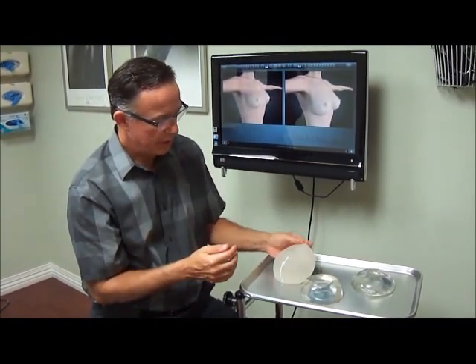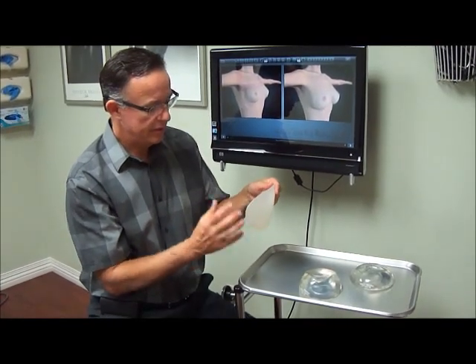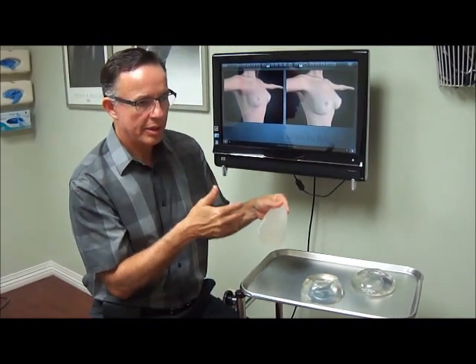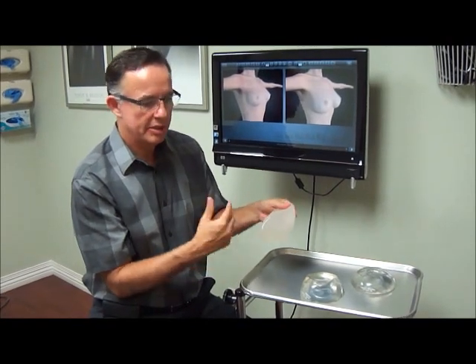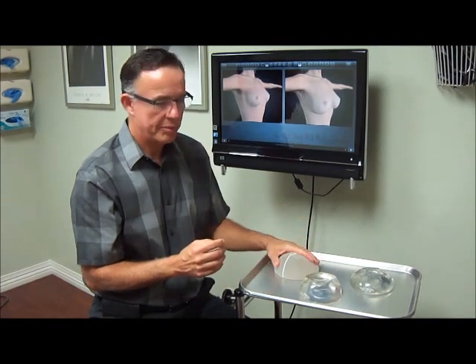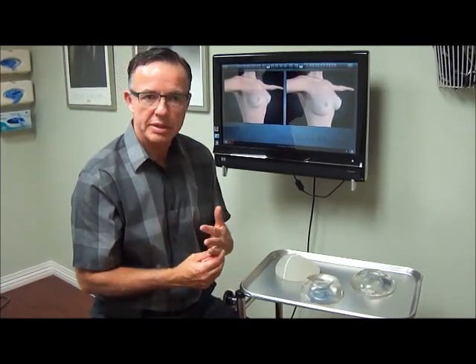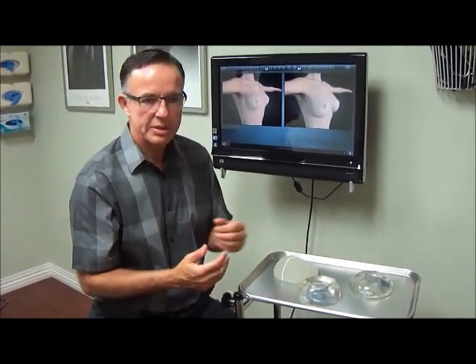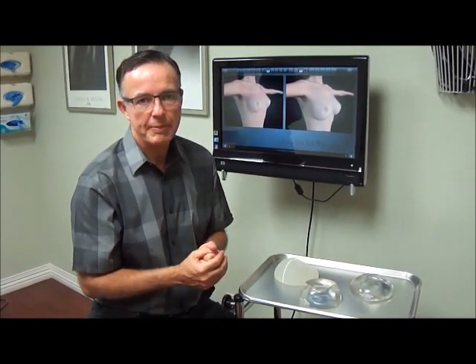Now, when do I use this kind of implant? I don't use them a lot because I tend to use them mostly when patients do not like their current humpy upper breast. So this will control that very effectively, and therefore I use them mostly for revision cases. I rarely use them for primary cases. However, I'm very open about options, and sometimes patients do have that desire to consider this kind of implant, and if it's reasonable for their situation, we will be more than happy to use them.